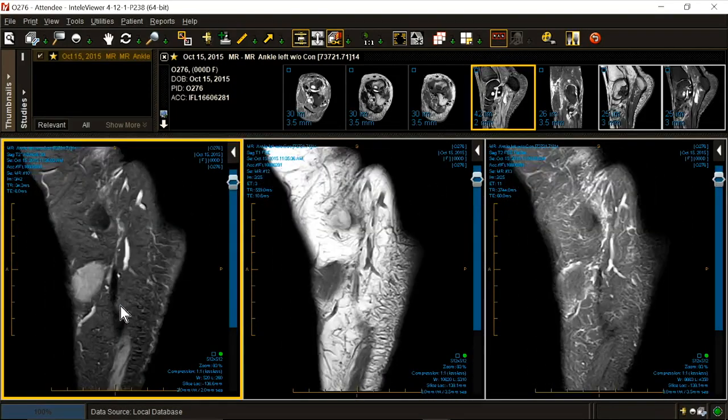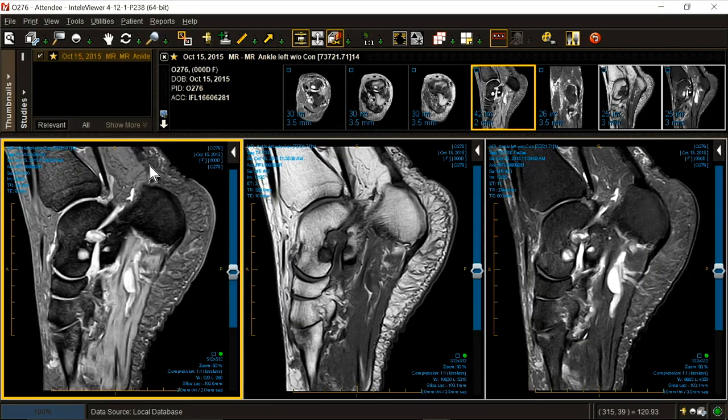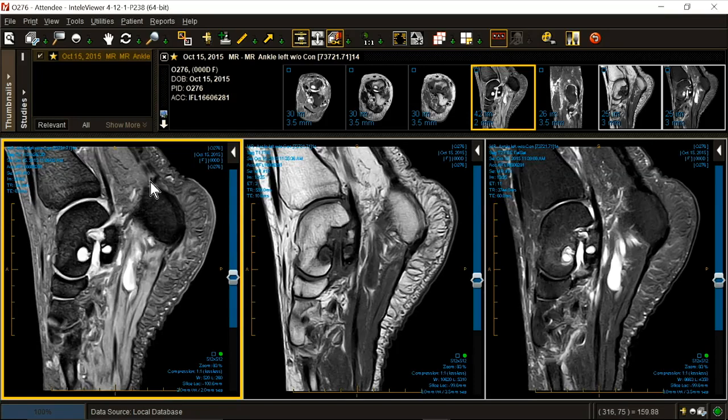How about the medial tendon group? Well, as we're whizzing by, there's the Achilles. It's gray, it's irregular, it's wavy. That's magic angle effect. On the T2, it dissipates. The anisotropic 55-degree artifact of having collagen oriented 55 degrees to the main magnetic field.